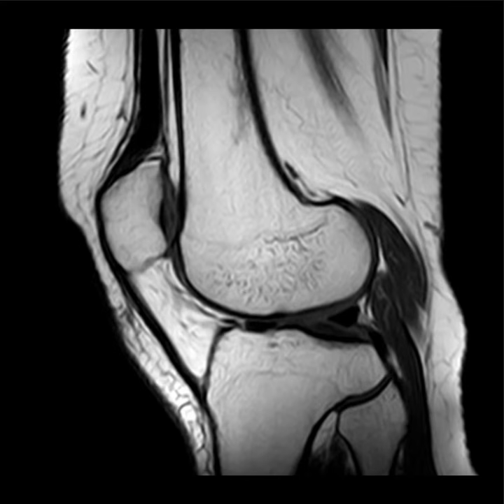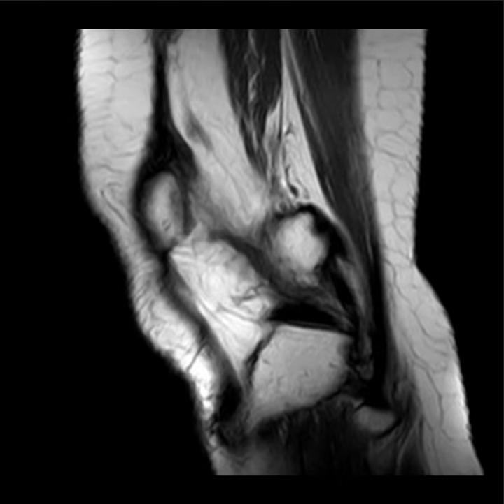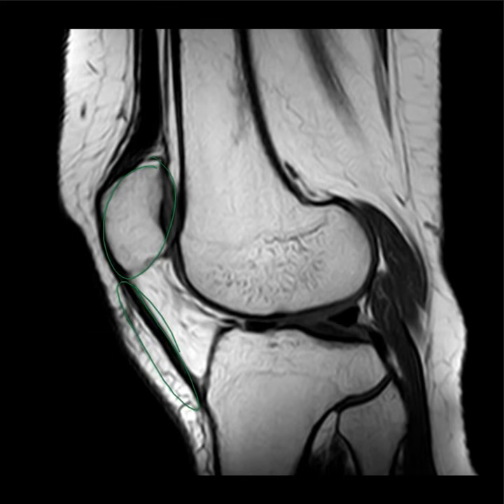And how do you know that? Well, this is easy. We need to measure the height of the patella and compare it with the length of the patellar ligament. If the ligament is longer than the patella, then this is patella alta, and of course here the patella is shorter than the patellar ligament, indicating a case of patella alta. Excellent. Good job. So you see, you need to look for patella alta in all cases of patellar dislocation and exclude its presence.